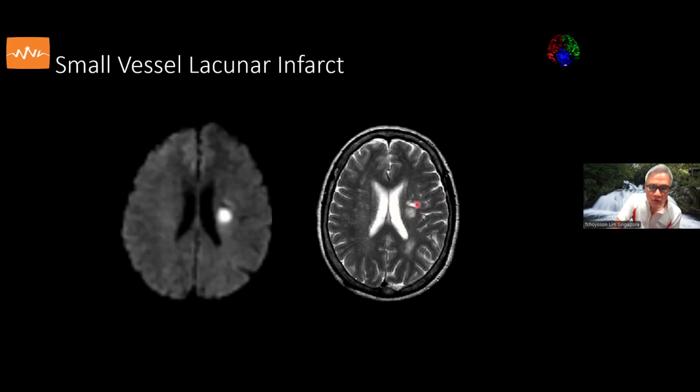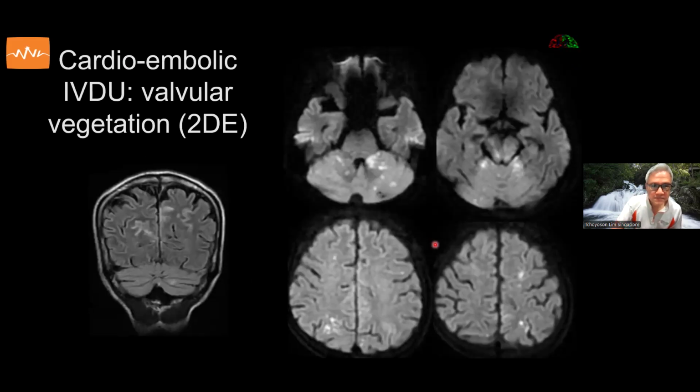So, although a chronic infarct and an acute infarct are both high signal intense on T2 weighted MR image, on the DW, it's very clear that the acute infarct has high signal and the chronic infarct does not, and in fact has low signal intensity similar to the cerebral fluid. So small vessel disease, and we can tell acute from chronic infarction.